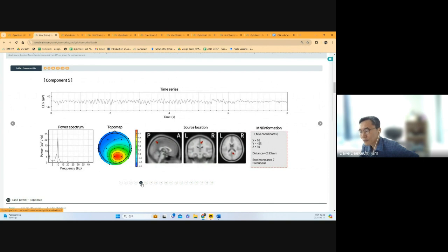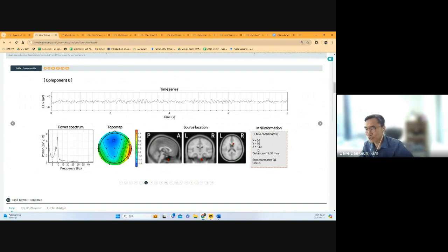And another one is the precuneus. The precuneus is the usual alpha source, midline and posterior alpha. This is the healthy alpha. And another one is the uncus. The uncus is a very central structure of the temporal area, right, central, a very low position temporal structure, also having this kind of slow alpha activity and a little bit of theta activity.